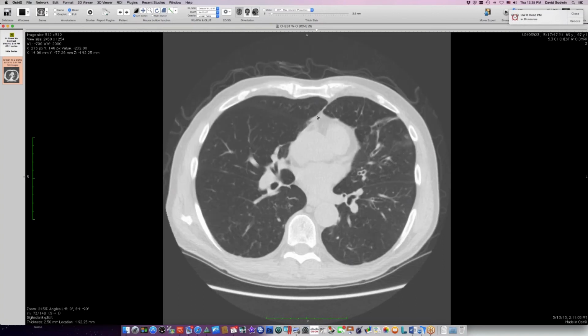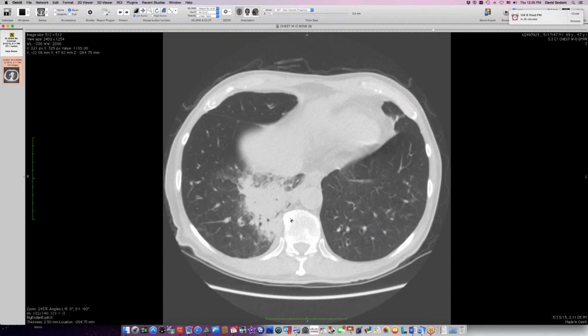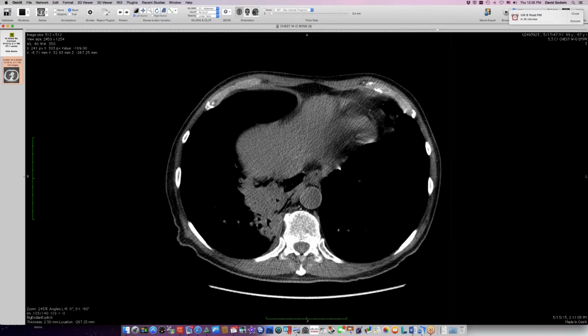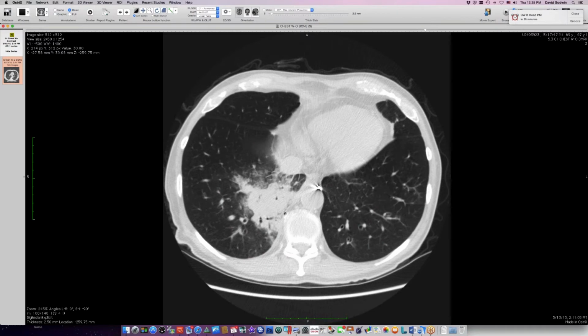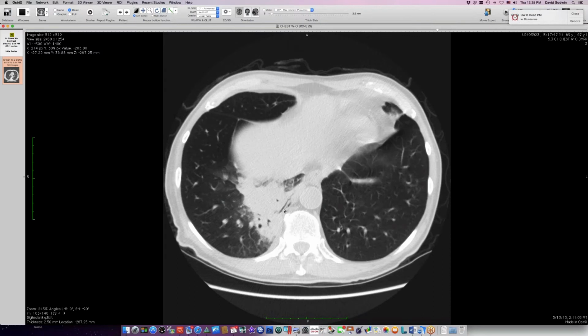And he has this big nodular, dense consolidation with surrounding ground glass, looking a lot like a fungal infection down here. So people who are on voriconazole or on Aspergillus prophylaxis who get what looks like a fungal infection makes us think about mucor, some zygomycete, which are often resistant to the agents that will protect against Aspergillus. So that was my first consideration.